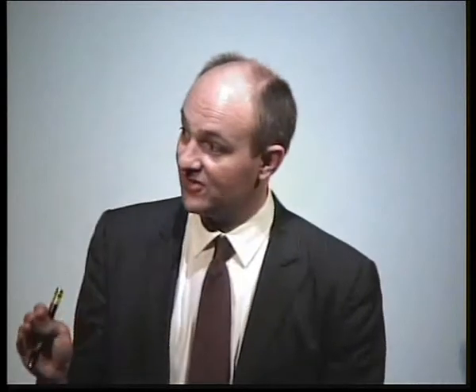I think if you really want to see the articular cartilage, the best way of seeing it is at arthroscopy. However, if you don't have arthroscopy in your sort of young adult management, and there are some of my colleagues out there, then using contrast to look at the articular cartilage is very helpful. These are plain MRIs. This shows some anterior articular cartilage cysts. That's the front, that's the back. Correct me if I'm wrong, Simon, but there's some cysts in the anterior acetabulum.